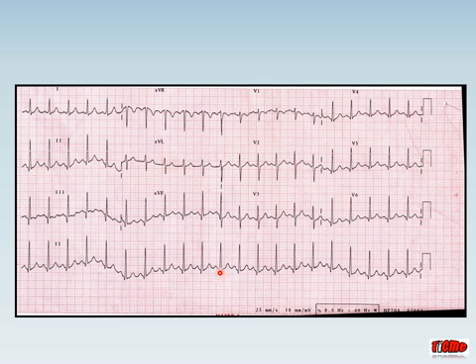And are the PR intervals the same? The answer is yes. The next question is, is the RP distance short or long? Well, from the R wave to the P wave is more than 50% of the RR interval, so this is a long RP tachycardia. As we said, this now means that our generation of atrial depolarization is coming from either the atria or the sinoatrial node.